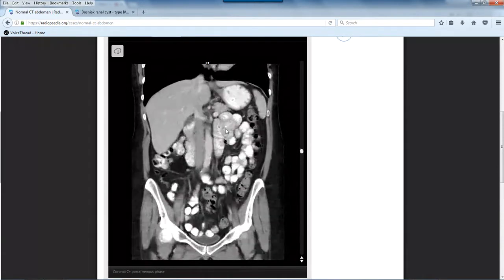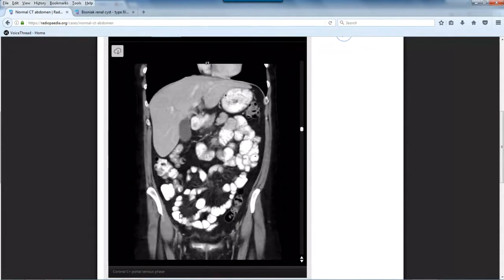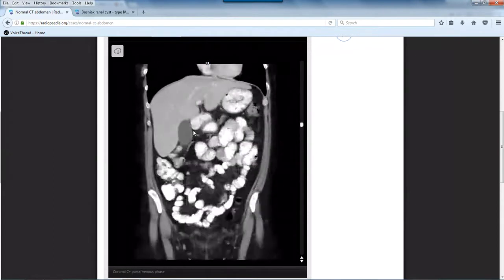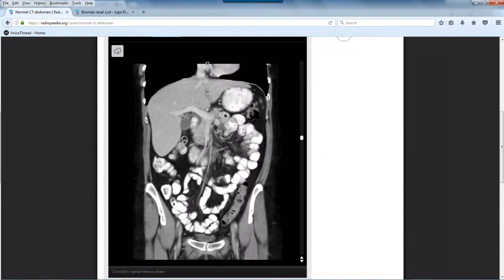And then all these smaller loops in between is your small bowel, okay? Your ileum is down in the right lower quadrant. Jejunum is mostly left upper quadrant. And then the duodenum is the smallest. It's just posterior or just distal to the stomach, kind of in this area, and it sweeps across and joins up with the jejunum. Okay, so that's really all I'm going to have you know as far as the intestines go, because that can be kind of hard to see, as you can tell.